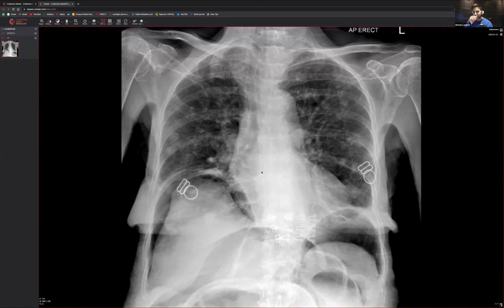Okay, so we're having a look at this chest x-ray. Again, my check areas would be the hilar areas. So the hila actually look okay. They look very, very sharp. So that's good. People have some good answers. I want you to think a bit further though. You give me one answer, there's two answers here. So think about that.